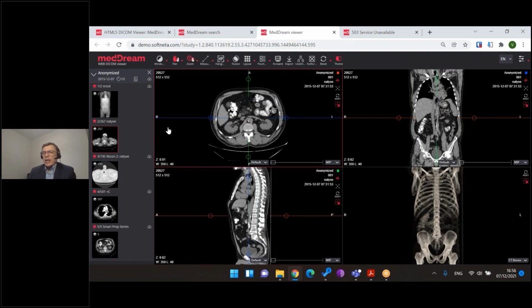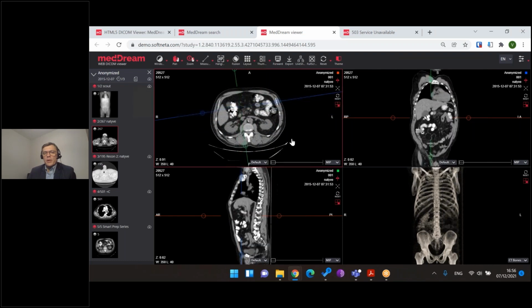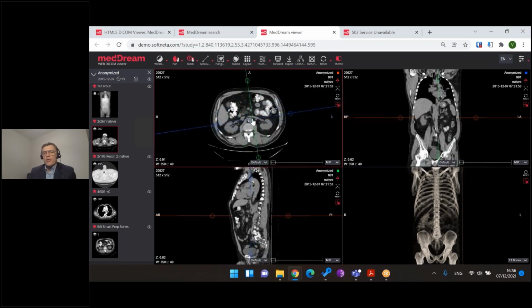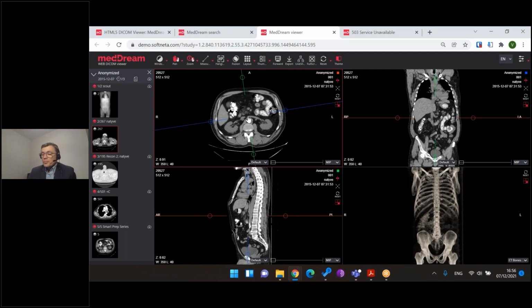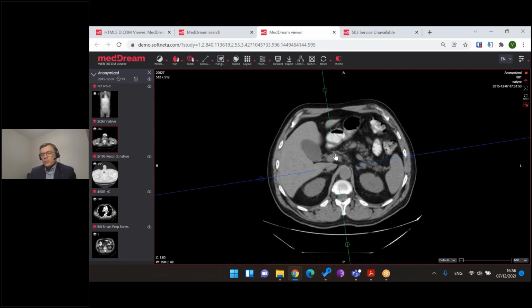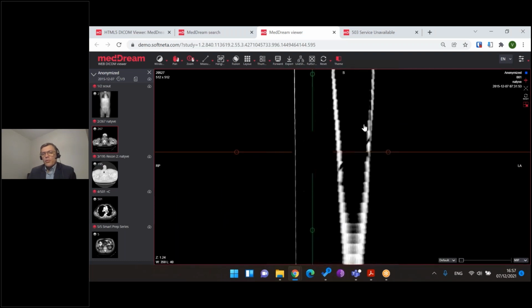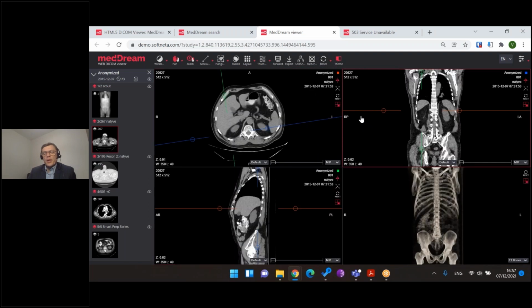This MPR means that I can disconnect internet and still work with the same smoothness. As you see, the performance is amazing. So the rotation is available. Also, you could change the MIP. You could select which methodology you like. So this is how the new MPR features look. And as I said, the performance, by double click, you could switch to the needed series and scroll through the whole study. So this is very easy to use.